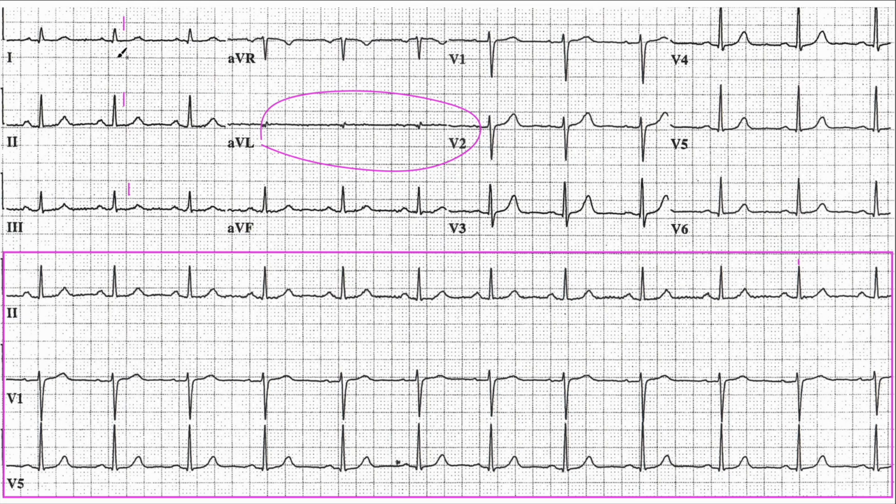AVR is inverted as it should be. Okay, sorry. I have a P wave here that's upright in lead 1. I have a P wave in lead 2 that's upright. I have a P wave in lead AVR that's inverted. I have a P wave in AVF that's upright. This is normal sinus rhythm. Now I can confirm it. So normal sinus rhythm.